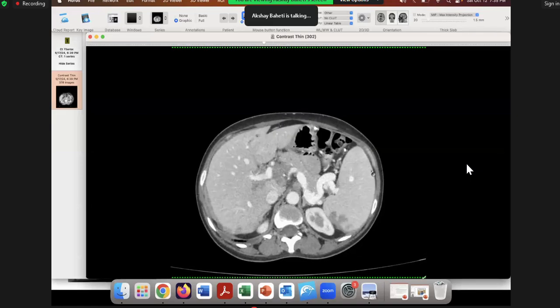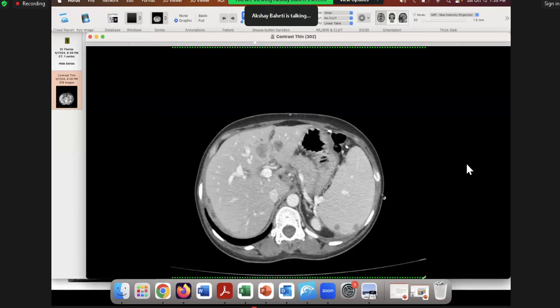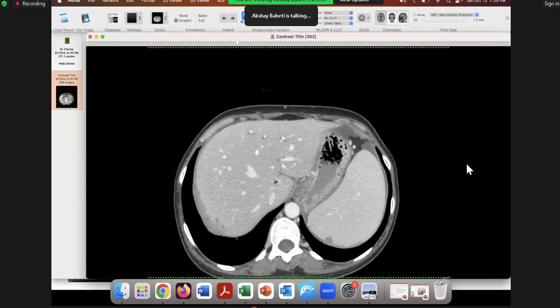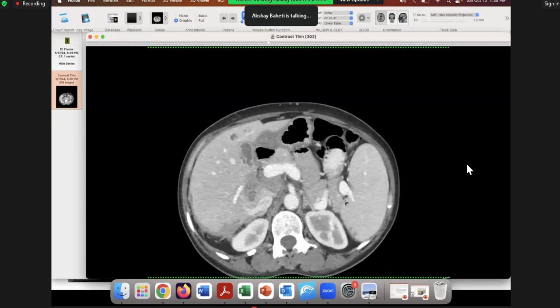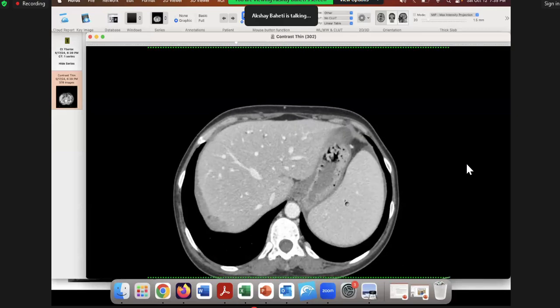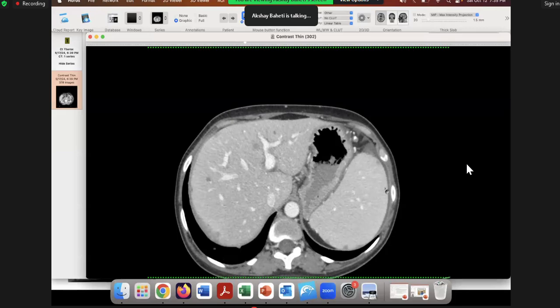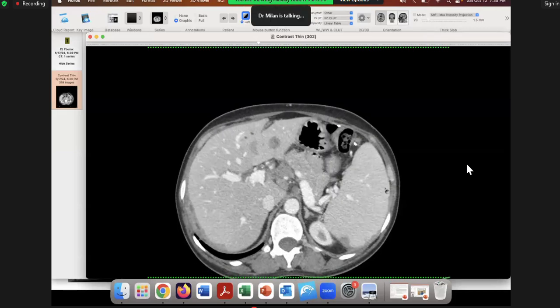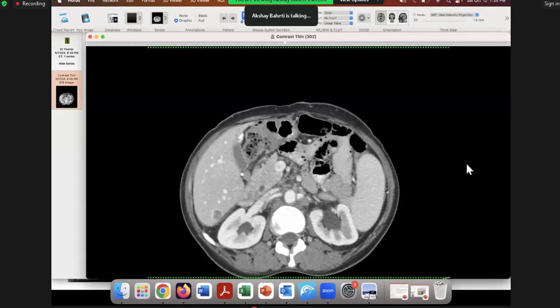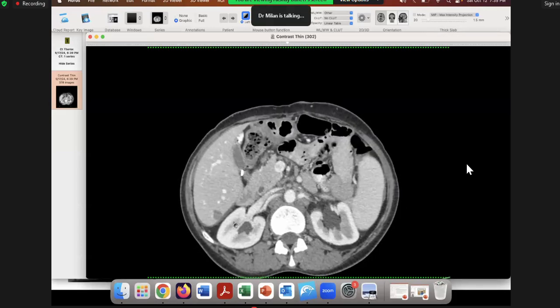Everything will depend on what you say. Look at this splenic stuff. Their question is very simple here. They're going to ask you, is there intrahepatic or intrasplenic disease, which is stage 4 ovarian cancer, or is this just surface deposit, which is stage 3 ovarian cancer? So what do you think is happening? Yes, sir. There are intraparenchymal deposits as well. Like this one, you think? So this is a surface one. This is surface.